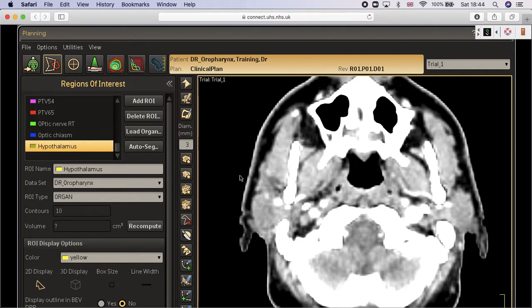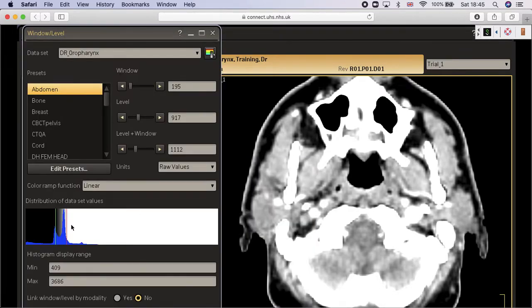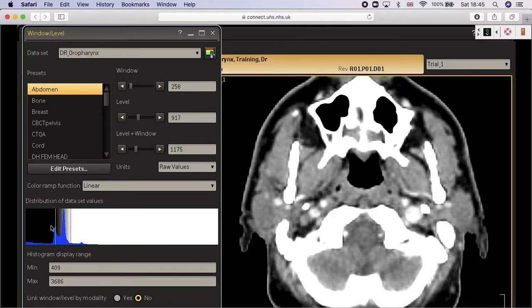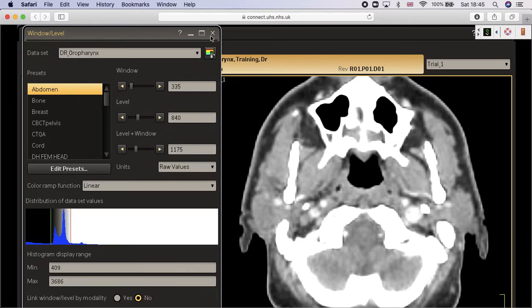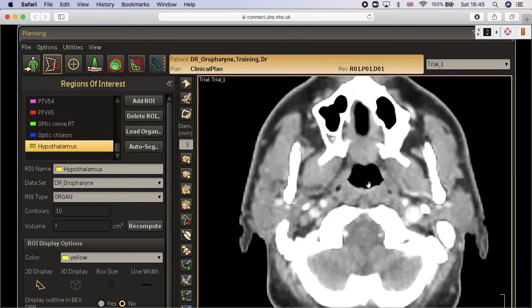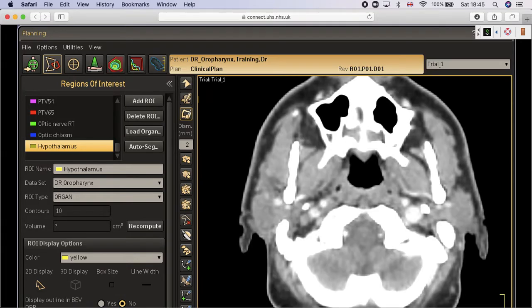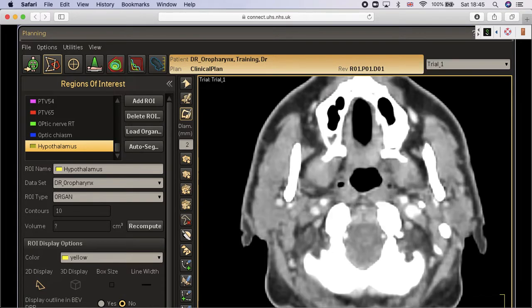So how do we draw the pharyngeal muscle in a very simple way? Again, guidelines are different. If you want to just stick to the guidelines, you don't have to stay with me. If you want to see how I'm trying to simplify it for myself, then you can still continue. There are several guidelines, honestly, telling us how to draw it, and I feel the easiest way is to draw it as one structure. This is number one. You can separate it into superior, middle, and inferior, and I can tell you how to do that if you want.